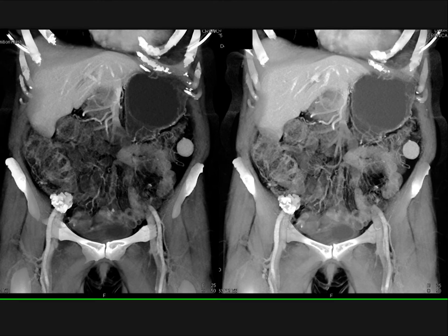Yes, you can think about a carcinoid, but that gives you a desmoplastic reaction. It's not so smooth. In a large node, that's a really strange location, and the node would have to be enhancing, and I see no other nodes. An omental implant, I guess you can consider that. It's a little bit to the left, but you can consider implants, but again, typically so round, so homogeneous.